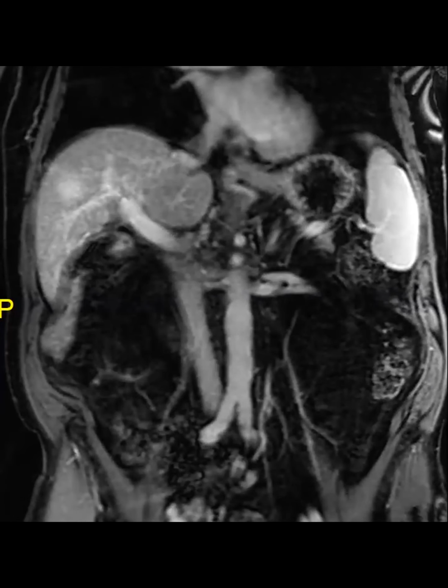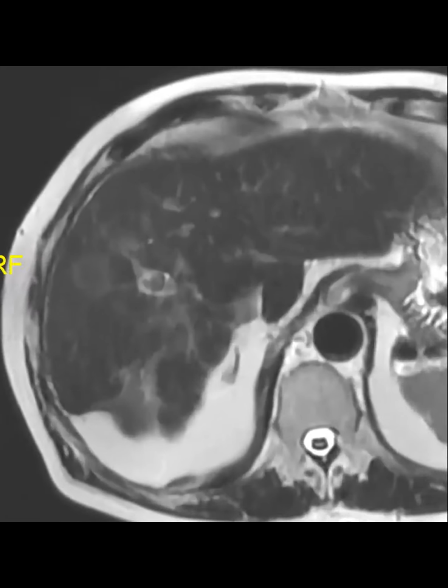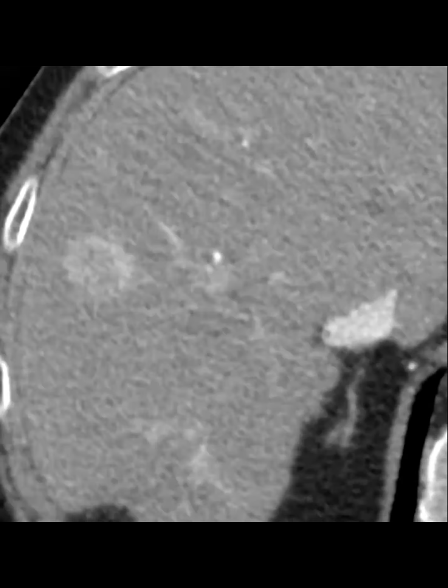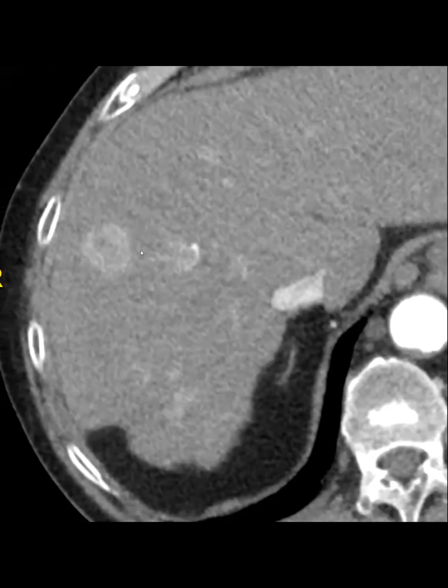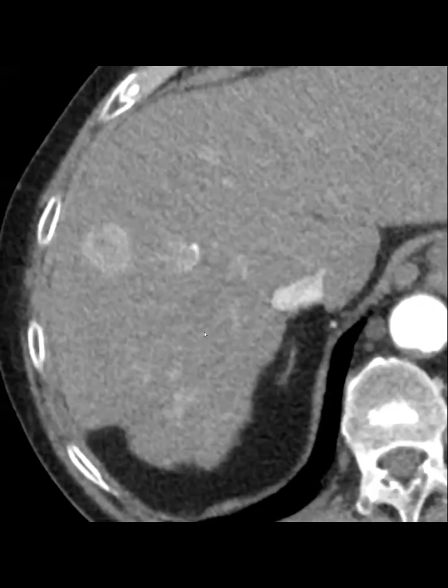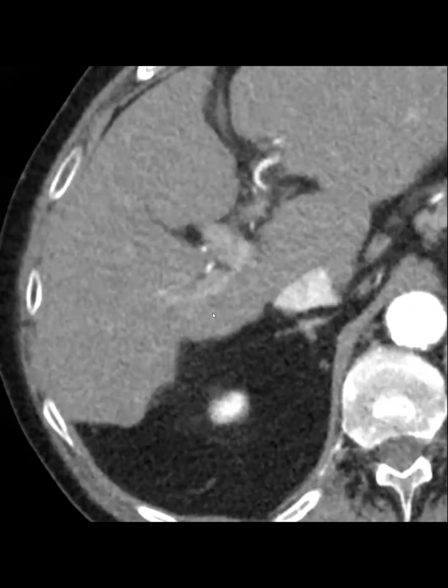Very unusual tumor. But when I look at T2, you can see that it had a very targetoid appearance, as it did on the diffusion. So at this point, I'm like, okay, there's convincing evidence that I'm not insane, at least not in this region. So I said, okay, fine, we're going to call it LR-M, rim arterial phase enhancement, LR-M, providing the differential diagnosis of atypical HCC, combined tumor, and cholangio. The patient went for biopsy, and it was a combined tumor.